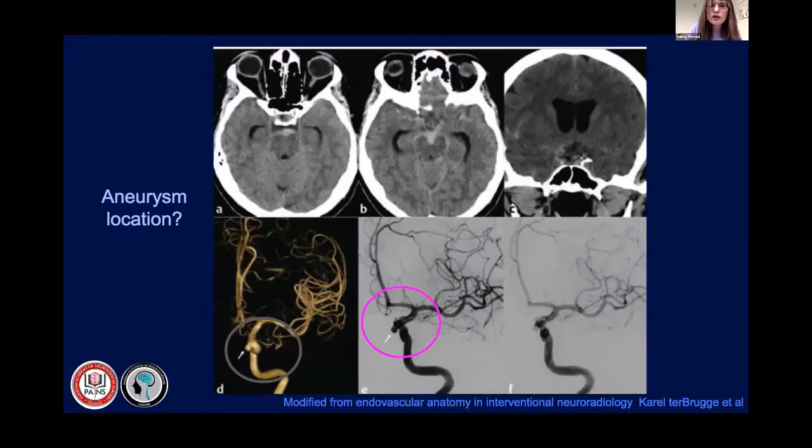And I showed you the carotid cave, that small pink triangle is the carotid cave. So these are typically the carotid cave aneurysms. And as I told you, they are not above the distal dural ring, but still there is arachnoid membrane going into this, and so they present with a subarachnoid hemorrhage. Again, this is not my case. I take it from one of my teachers. So this is subarachnoid hemorrhage, and this is carotid cave.